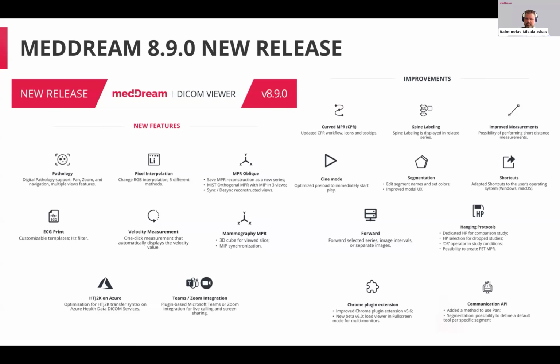Hello, everybody, and welcome to our presentation. Today, I'm excited to present the latest MedDream 8.9.0 version. I will walk you through the key changes, the new features, and the improvements we have made. At the end of the presentation, as Renata mentioned, I'll be happy to answer all your questions. So let's get started. As seen on the screen, we did a very big job, creating more than 10 new features and more than 15 improvements. So let's start from the first one.